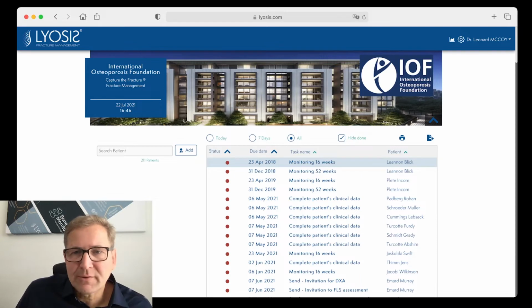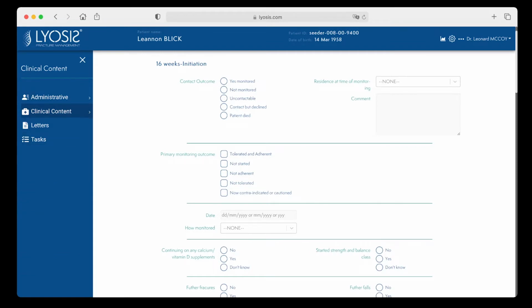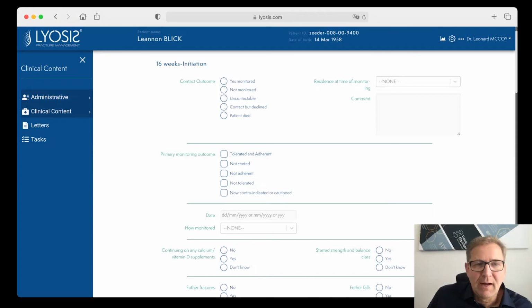But before we go into this detail, just click on the patient here. Then you can see on the left side a menu which is always related to the patient. When you have clicked on the patient and the menu on the left side is opened, everything you see is related to the patient and to the task you have to do.